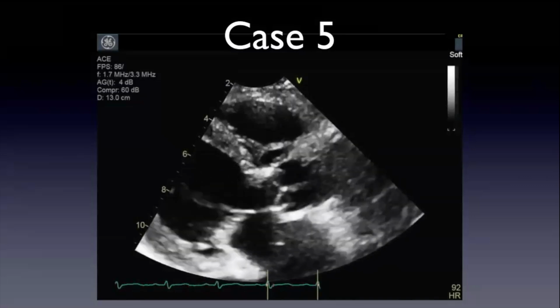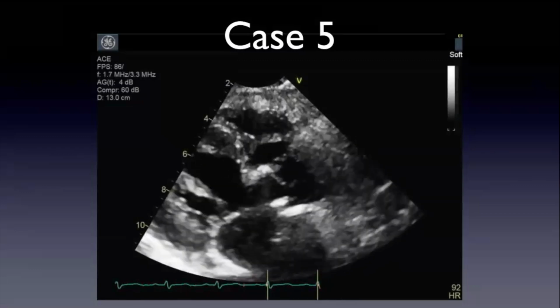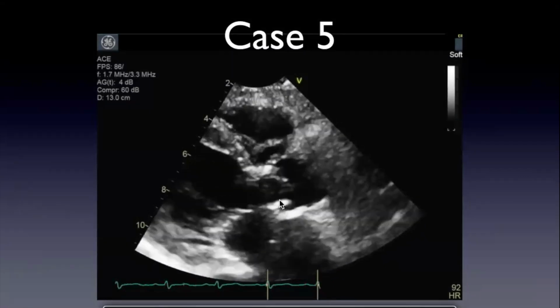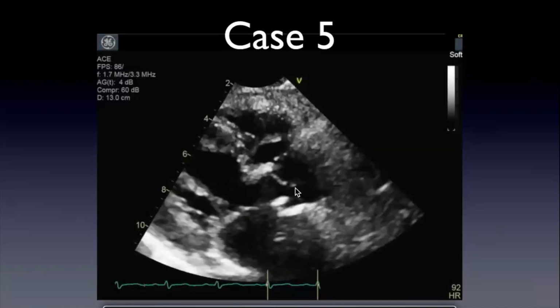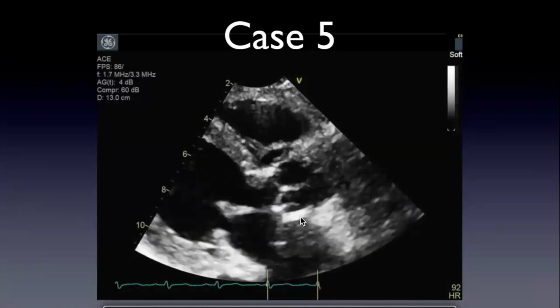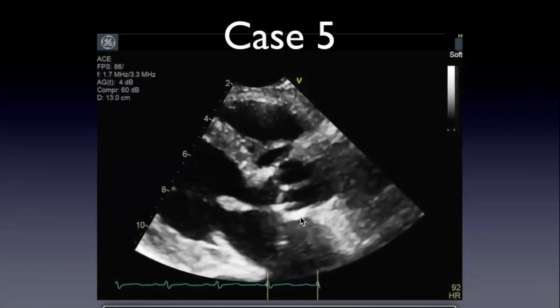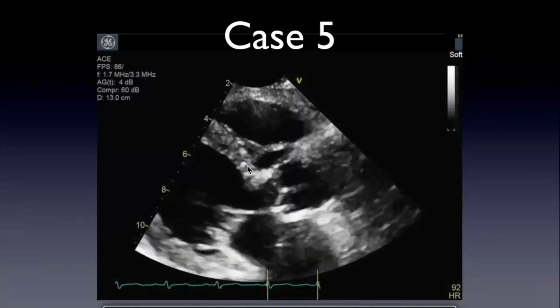Parasternal long axis, mitral valve, looks like it too. And then I wonder if there's something on the anterior aortic valve. Oh, you mean over here? Yeah, well, it's a brand new bioprosthetic valve. It's a little bit bright. This is probably artifact here. And the septum looks a little bit sigmoid, and maybe there's some hypertrophy that you see in the ventricle. Yeah, so maybe out here. There's a bit of tapering here when it gets to the annulus.